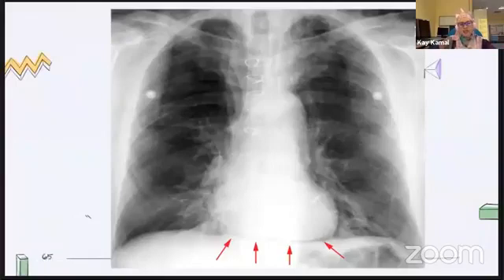If the X-ray is very badly inspired, for all of those I take 9 to 10 because I'm quite lenient like that. So I take 9 to 10.